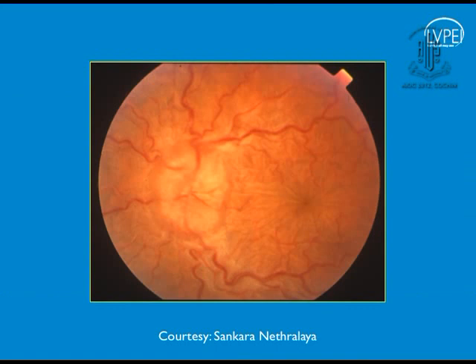This eye has hypotony maculopathy, and because of hypotony, again there is axoplasmic stasis and there is disc edema. This is an example of true disc edema seen in hypotony.